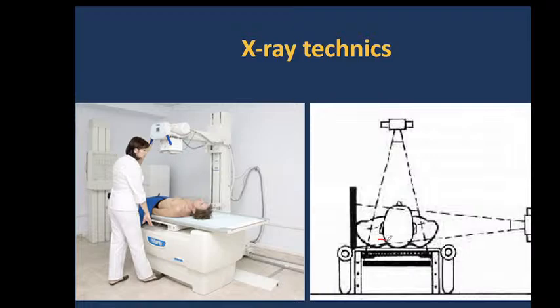So a lot of structures located in the body will be combined on the screen, and it requires certain skills from you to read and correctly interpret this image, because all the structures are in the same image.